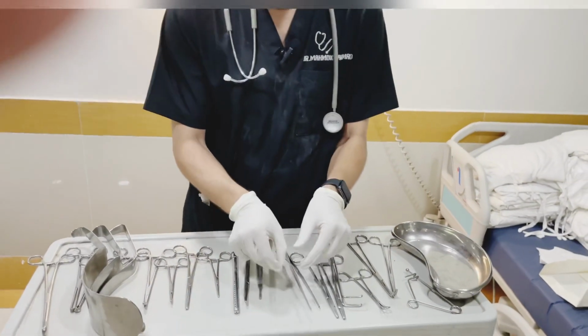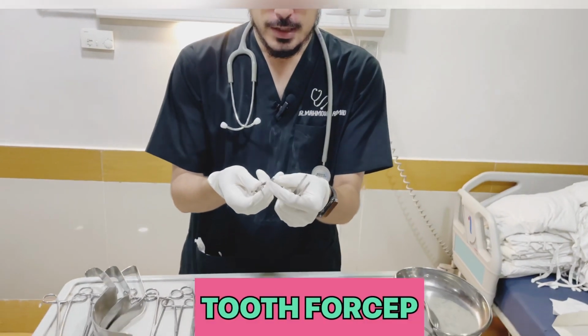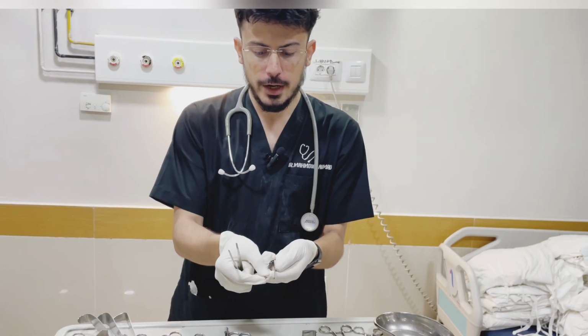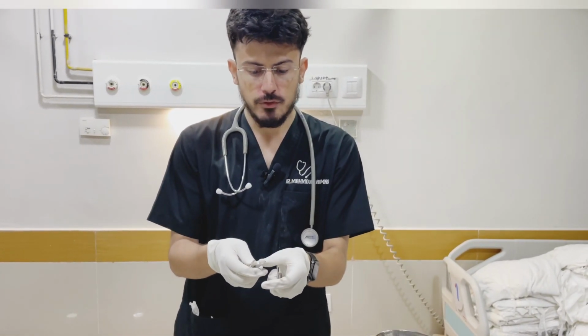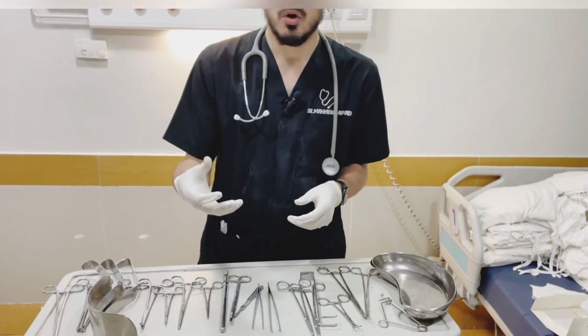Now these are the different forceps. This is the plain forceps, and this is the tooth forceps. The difference is that the plain forceps has continuous vertical lines, and the tooth forceps has a bit of teeth at the terminal portion. Usually they are used to hold the skin.